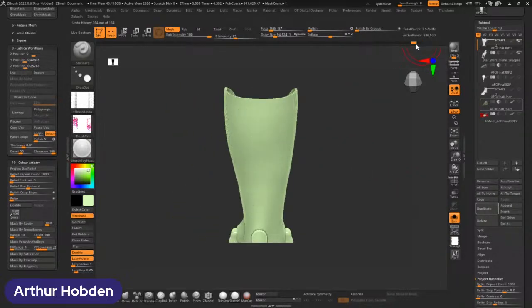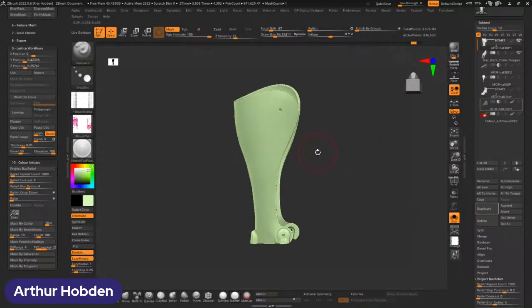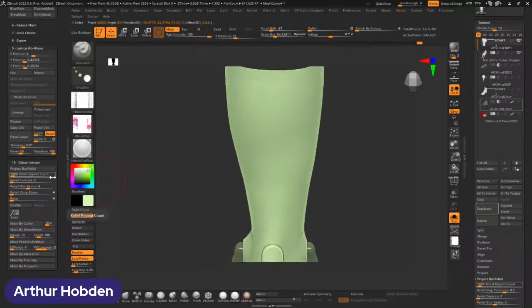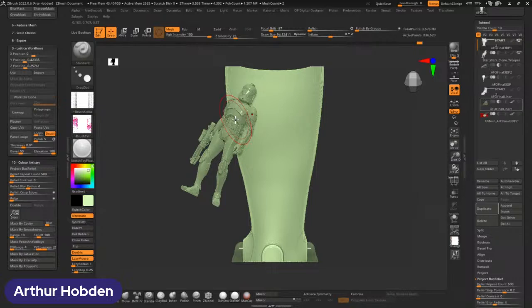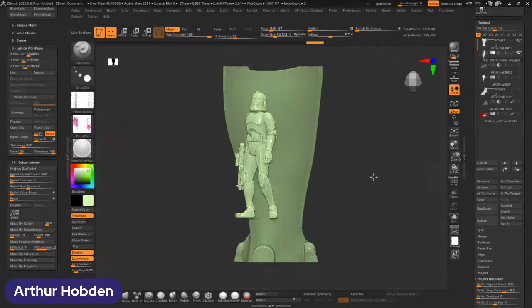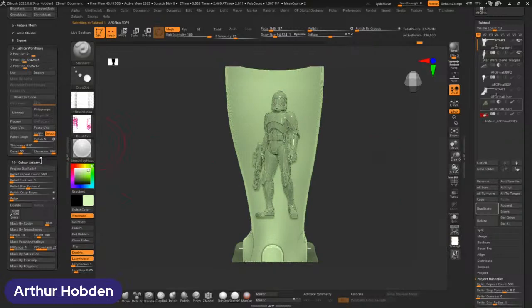Now, we have to make sure we're following, let's mask away everything except what we want to have a relief on. We can change the relief height. So crisp edges, relax, so relief repeat count. Let's try 500. Contrast, relief. Let's see. So solo, turn that, get him back to where we want him. It's all based on your viewport. So if we do that and change this to 500, I think we can try that again. Oh, again, got to be in the right subtool here.